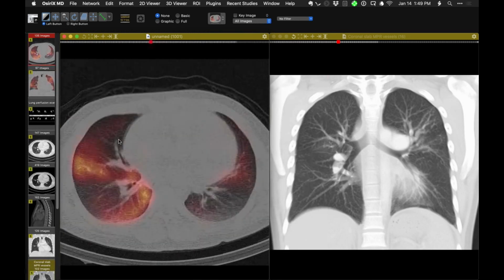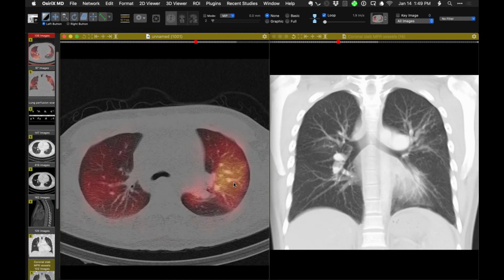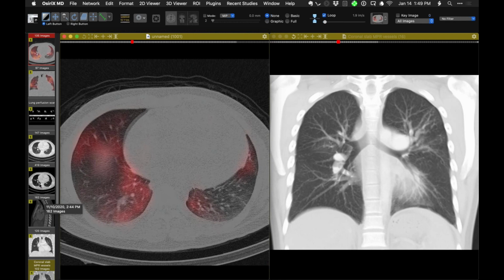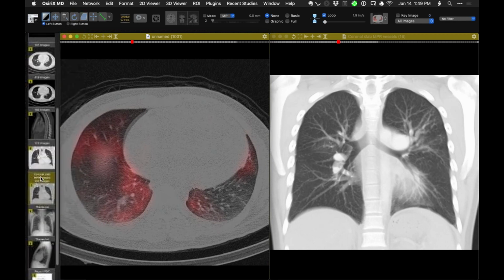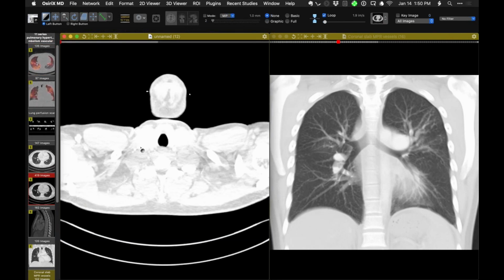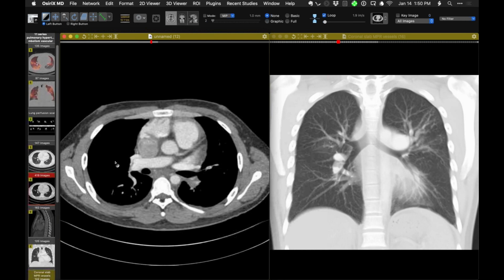Now, what you see, of course, depends on how much and where the intraluminal thromboemboli or organized emboli are in a patient. But of course, if I show you the CTPA, you'll anticipate that we're not going to see much in the way of vessels there, and that we're going to see a lot of clot there.